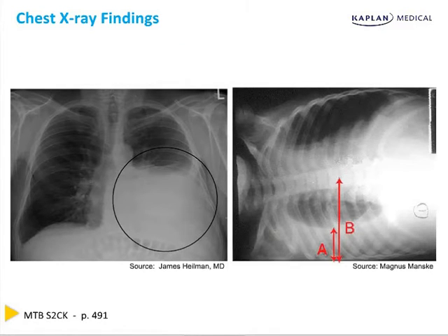The image on the left shows a drastic example of a pleural effusion, which results from fluid accumulation in the space between the visceral and parietal pleura of the lung. This condition is most often associated with left heart failure, but can result from many other etiologies as well. The classic finding of a pleural effusion on X-ray is a radio-opaque area in the dependent region of the lung.